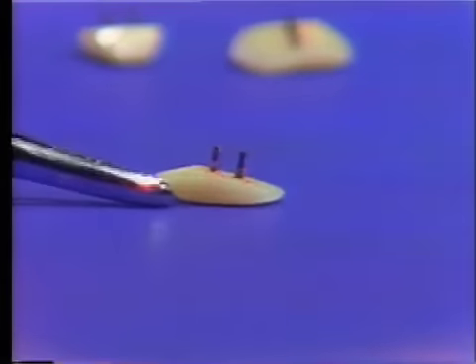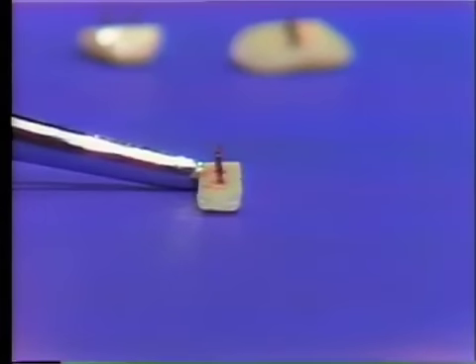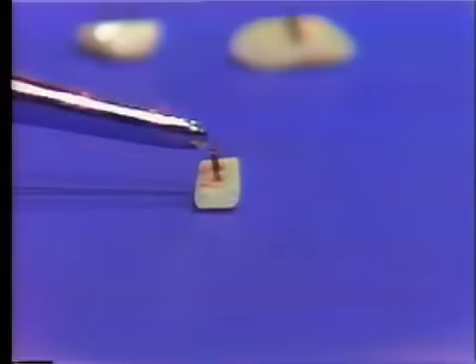Here is a long pin facing for a mandibular incisor tooth. Because the mandibular incisor is a long, narrow tooth, the direction of the pins is reversed, and they're placed one above the other instead of one on this side and one on the other. So just a little difference in the mandibular incisors in that form.